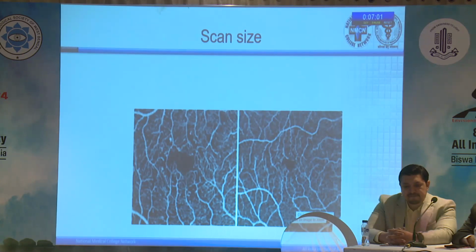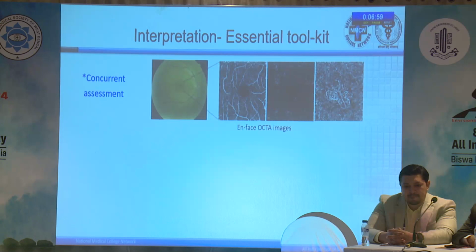bulk motions because of the eye movements can occur if the scan acquisition time is prolonged. Now coming to the interpretation, whenever you are interpreting an OCT angiography image, you have to do a concurrent assessment of multiple things that you have to take care of.